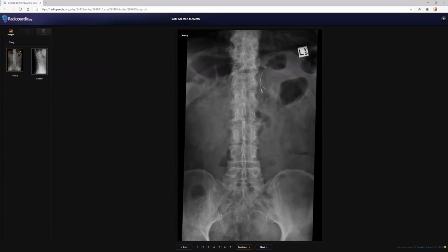Yeah, they had previous surgery. Previous surgery. So if there is some malignancy, possibly these are lytic lesions involving the pedicle of this particular vertebral body. Which vertebral body? This is D11. This one? Yeah. No, this is the gas shadow. Sorry, this is a gas shadow actually. I think this is the overlying gas shadow.